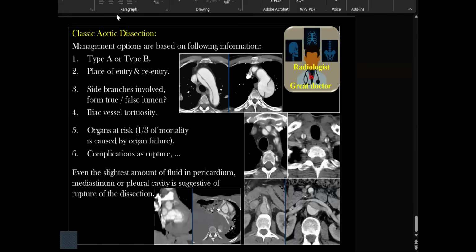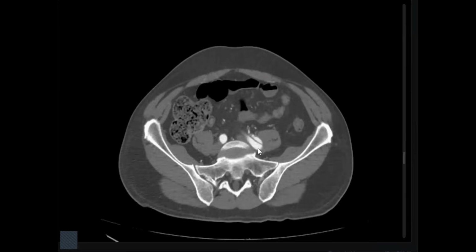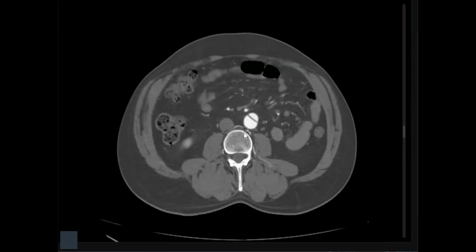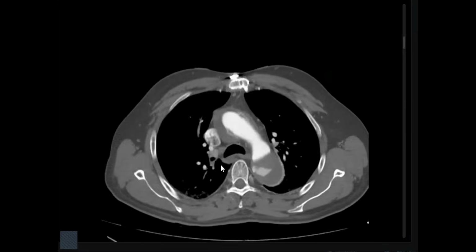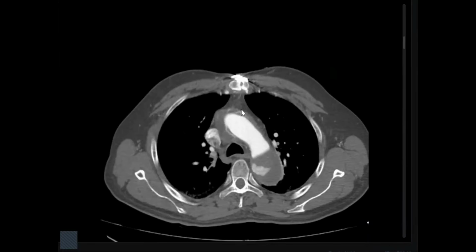During reporting, whether long or oral case, mention the start point and the end point. Here it started in the ascending and terminated at the nearly bifurcation of the left common iliac artery. Very good. So the start point and the end point, complications and extent of the flap.